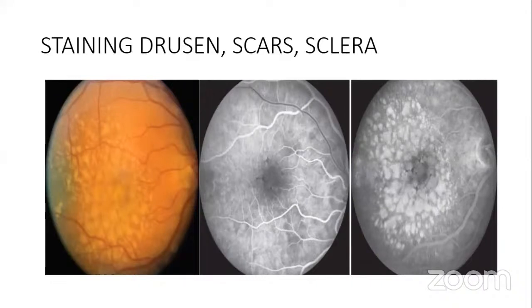From there, you get to the venous phase and then the veins. It's a continuation, so don't think about it, just follow the sequence. Choroid comes in first, then your arteries start filling. Arteries move down to the arterioles, then to the capillaries, to the venous, then to the veins. Then you have a recirculation. That's how it goes.